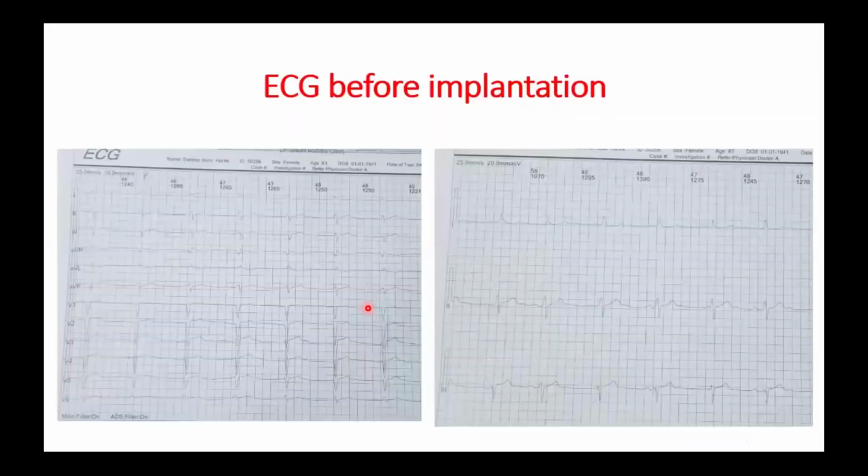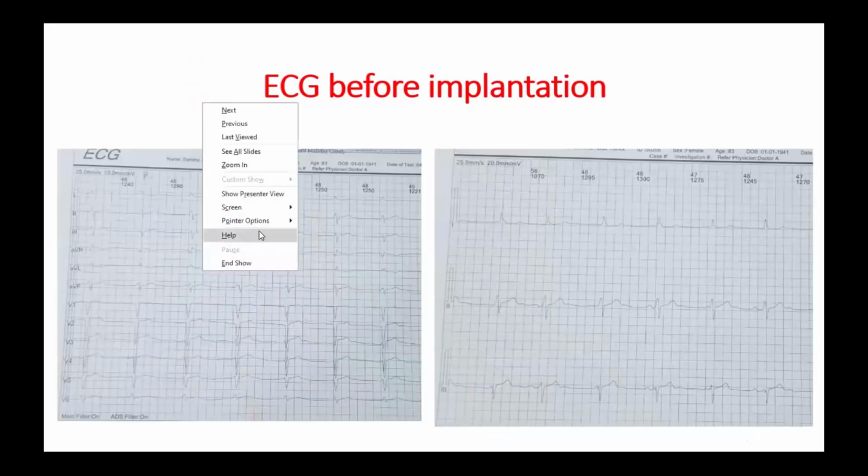This is before implantation, and a lady who is having dizziness, and this is her ECG. What is the diagnosis of this ECG? Because this is the clue for the pacemaker ECG. What is this, Hammam? It looks like Mobitz 2. No, no. Do you see any P wave?